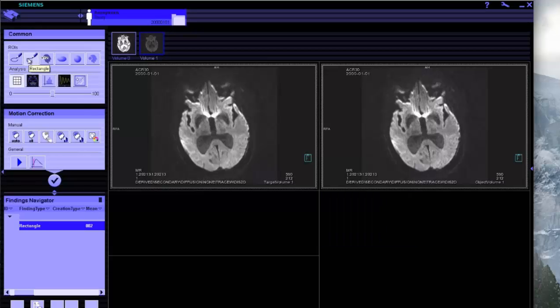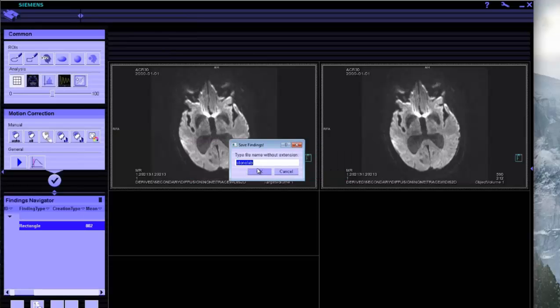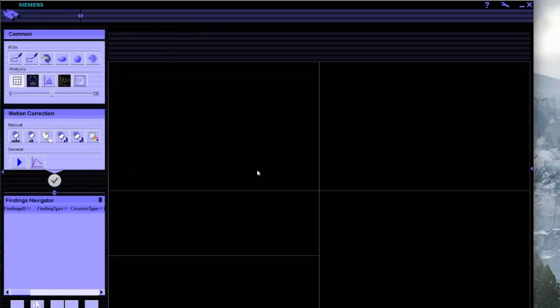But that's it. So hit task complete and save. Yes. Okay. And then you can close.